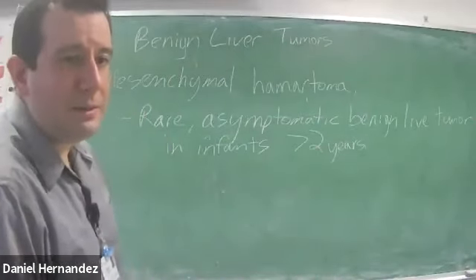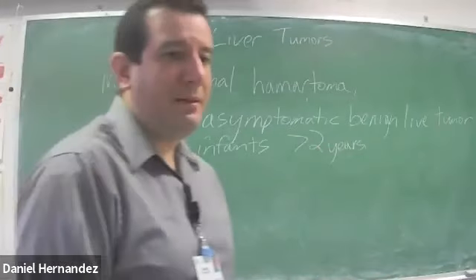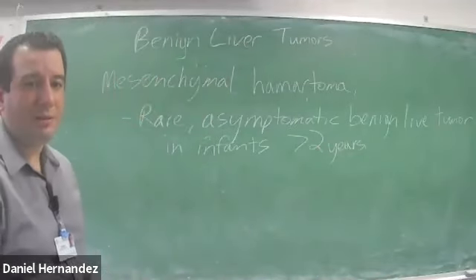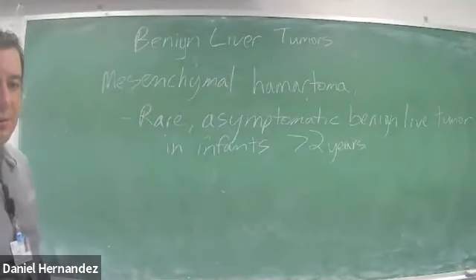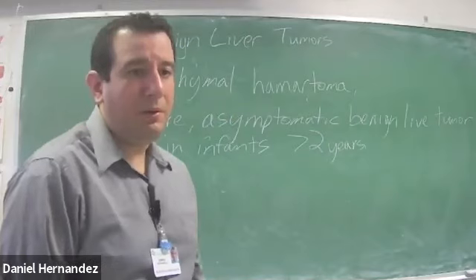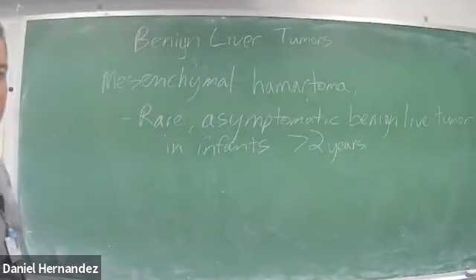The tumor has multiple septations and is a cystic complex mass derived from periportal mesenchyme.